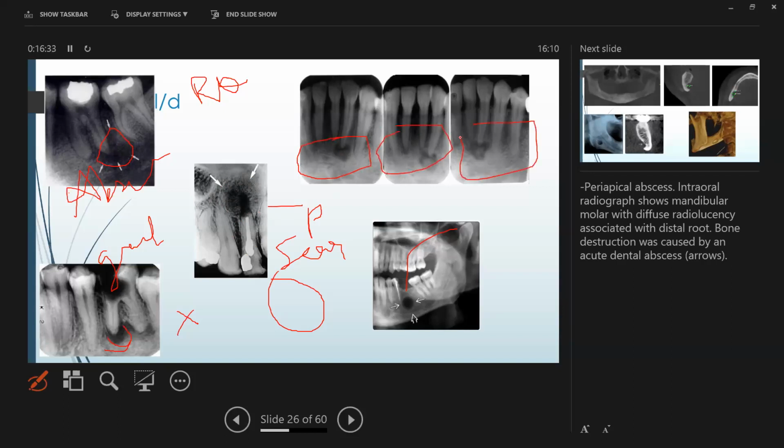And you can see multiple cystic lesions where the epicenter is in the lower anteriors, more common in females, but these lesions will be multiple. Okay. There will be no history of trauma, and all the teeth will be vital. All the teeth will be vital. But what we read here in a periapical abscess, granuloma, and the cyst, all the teeth are non-vital. So this is the only differentiating feature. When you see vital teeth, especially the epicenter is in the lower anteriors, and it's especially in the females, then you can directly give a diagnosis of PCOD, that is periapical cemento-osseous dysplasia.